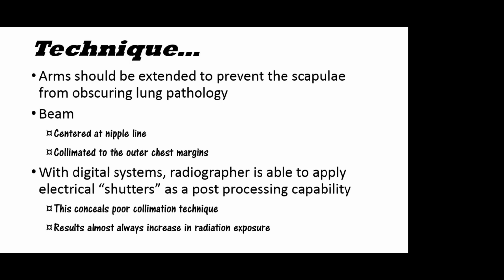So you need to be after the technician about what areas to expose, because once they have this capacity, they can do it during processing. So this conceals a poor collimation technique, that almost always leads to more radiation exposure to the baby. We'll see what this collimation is.